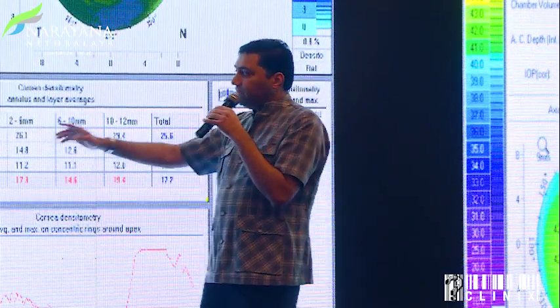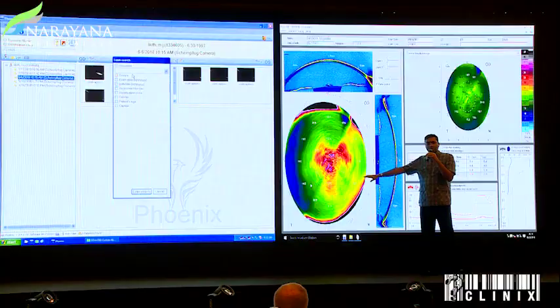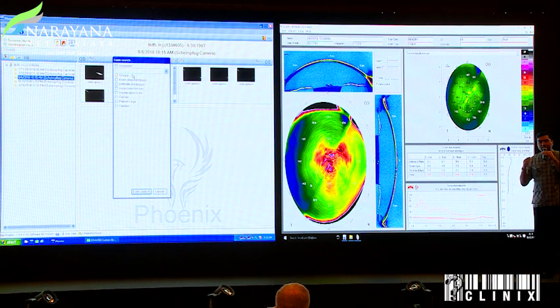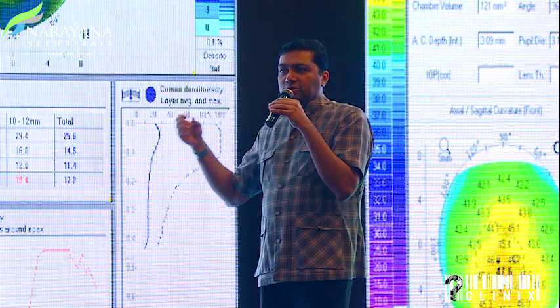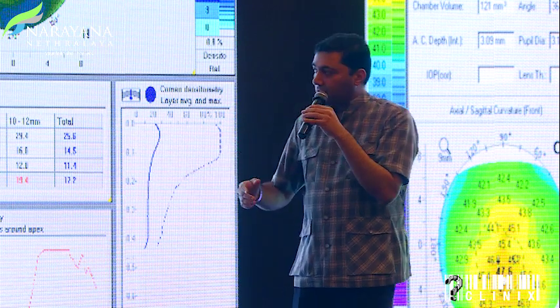One of the major issues with density, I believe, you can correct me, is not your curvature map, it's your Pachy map. So many times, the higher the density, the pachymetry looks artificially low. That means some people said, I did a cross-linking, and post cross-linking, I'm showing a pachymetry low of 100 microns. And once the densitometry becomes back to normal, I think it gets better. So the densitometry is probably one of the most important hidden tools for me in the machine, which you need to do when you're looking at outcome of cross-linking.